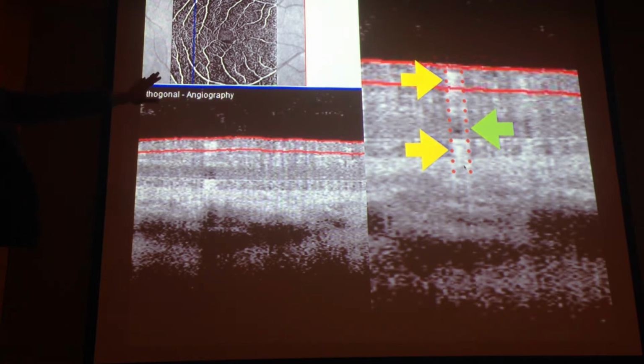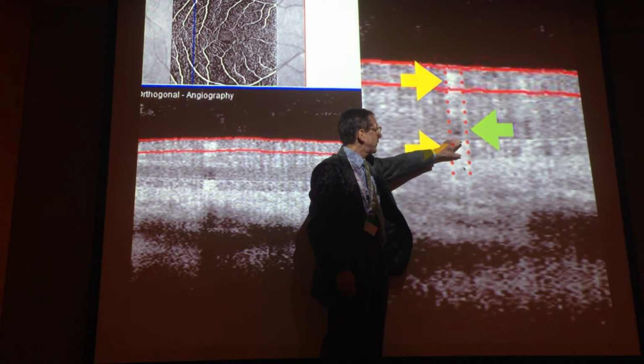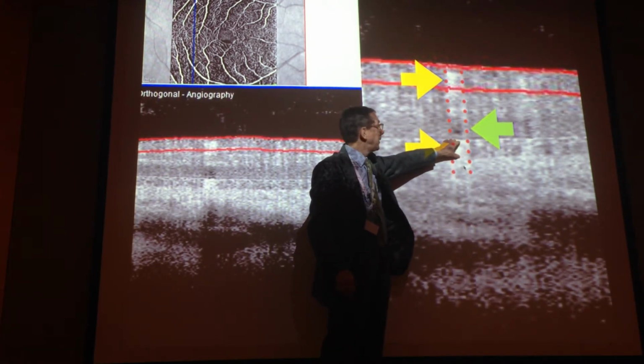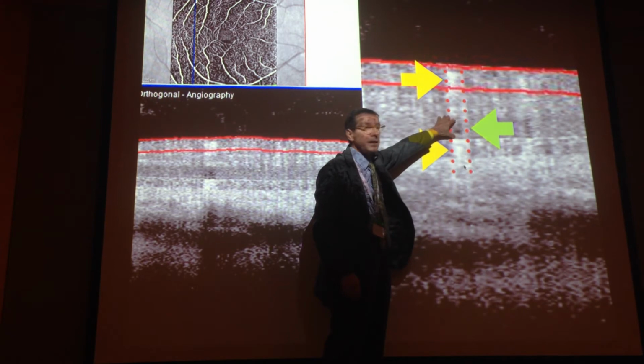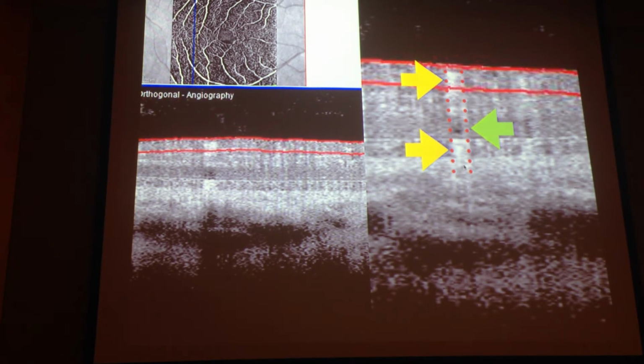By the way, this is a B-scan angio, so it's not a normal OCT scan. But the eye is perfectly intact. It's a normal eye, and of course, here the RPE is here, so these are at the level of the photoreceptors. But again, why is this not visible? The light is coming, all of a sudden disappears at the level of the nerve fiber layer, and then reappears.